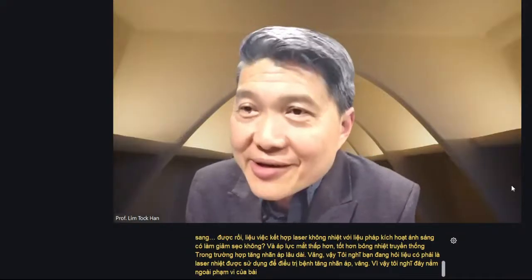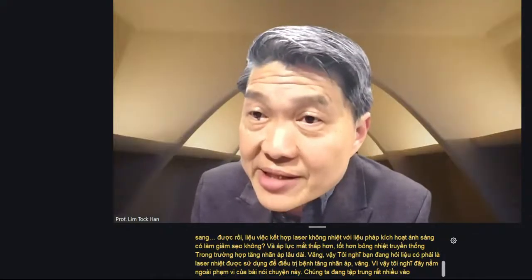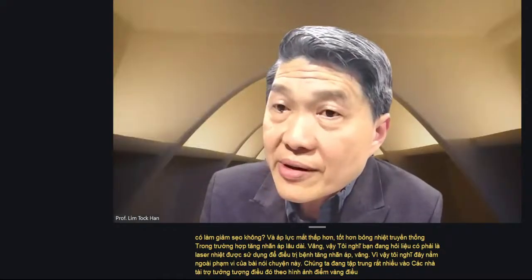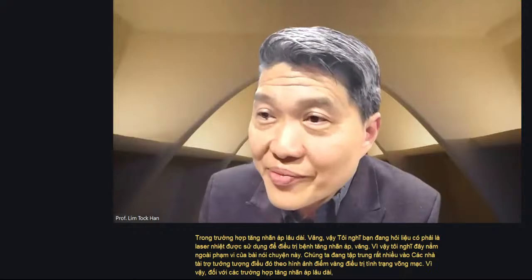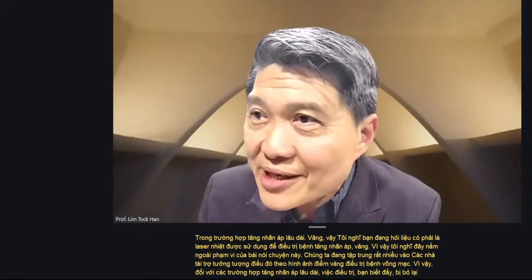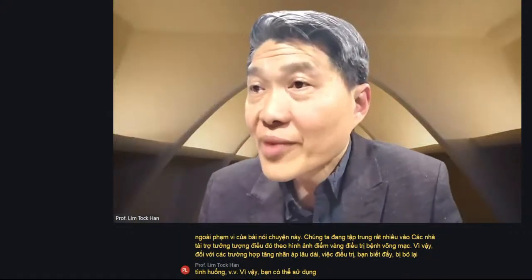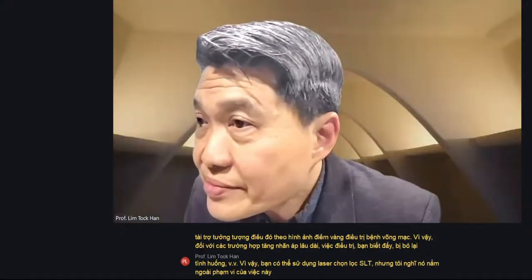We're focusing a lot on fundus imaging in terms of macular imaging, treating retinal condition. So for long-term glaucoma cases, the treatment is drops, stent, filtration, etc. You can use selective laser SLT, but I think it's beyond the scope of this talk.